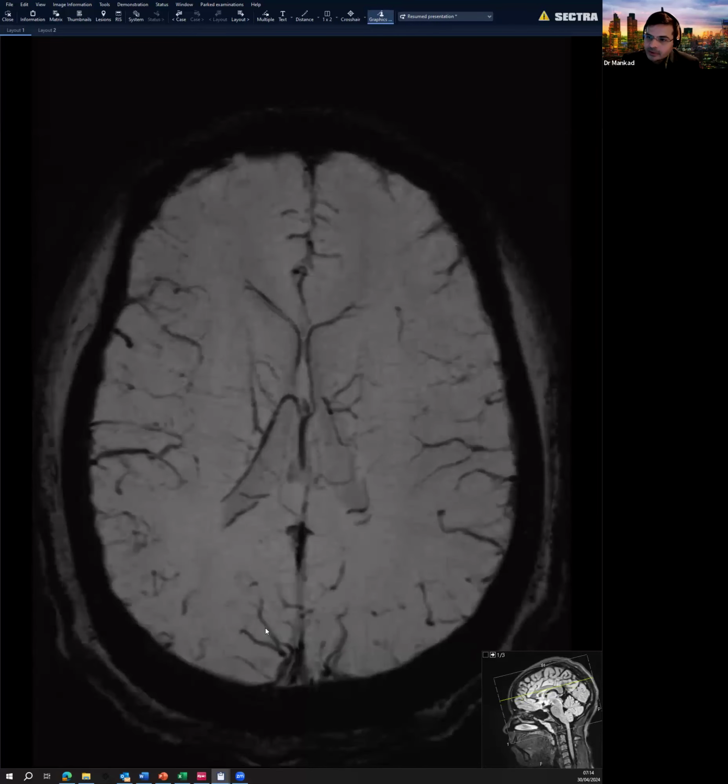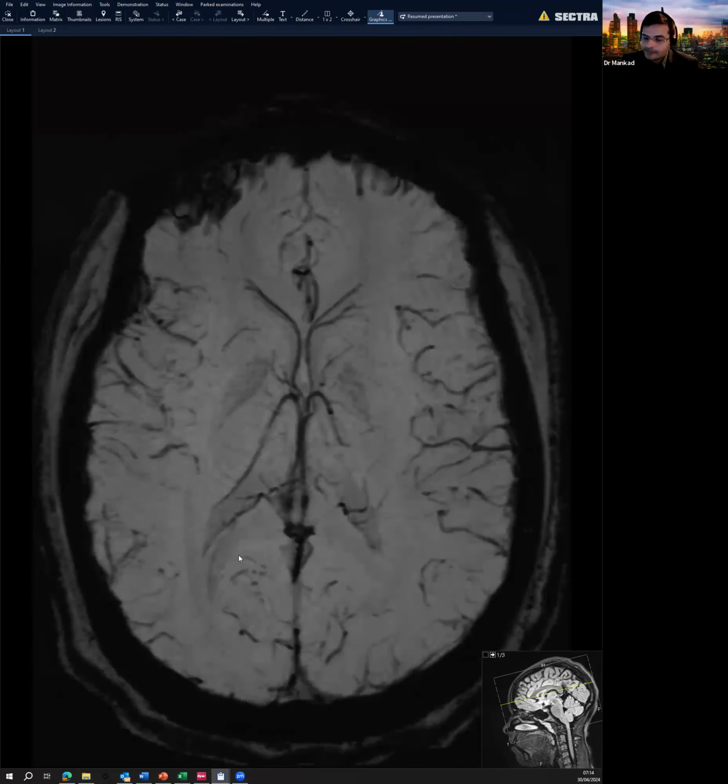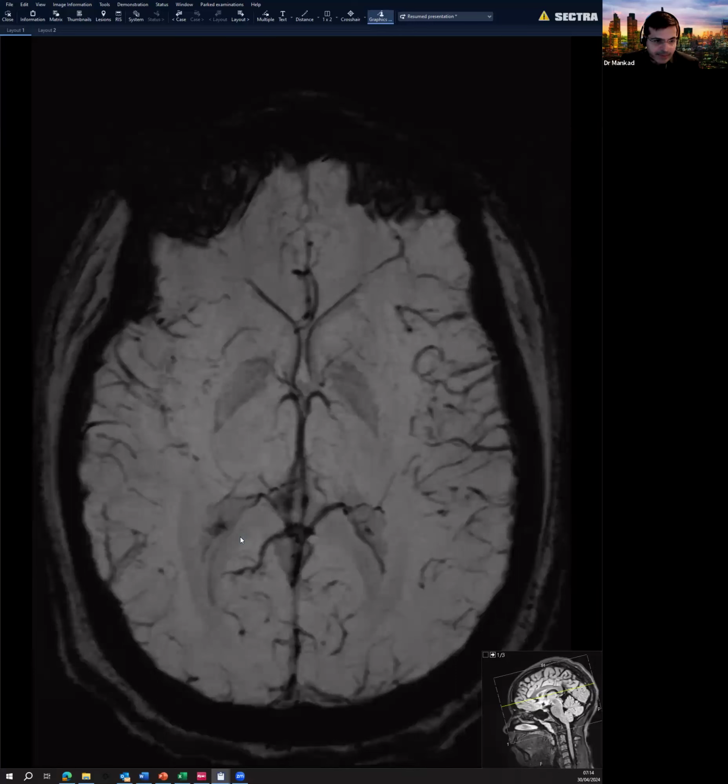That means when there is an acute stroke kind of situation where there is swelling in the brain or there is a delayed venous return, you will start encountering abnormalities, and just comparing the left to the right will help you in a significant way. So that is susceptibility weighted imaging, and these are all interplay of different sequences that we have been talking about today.